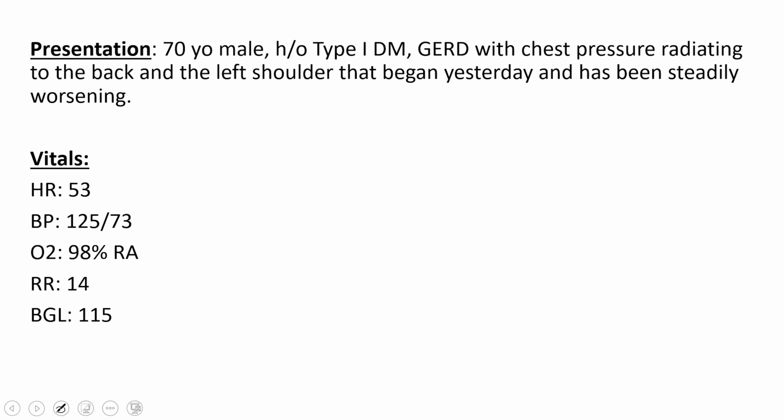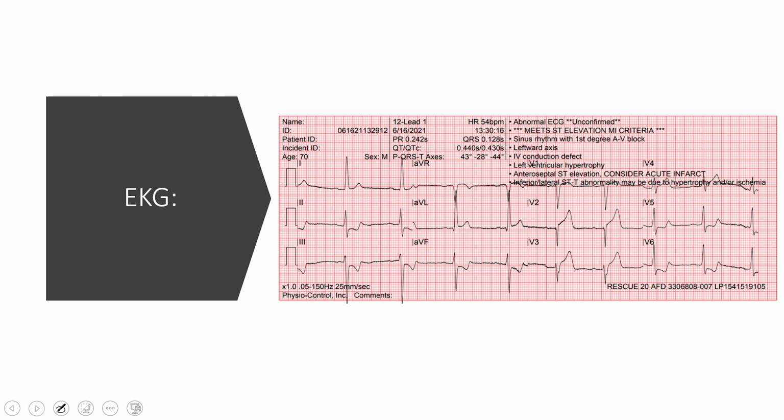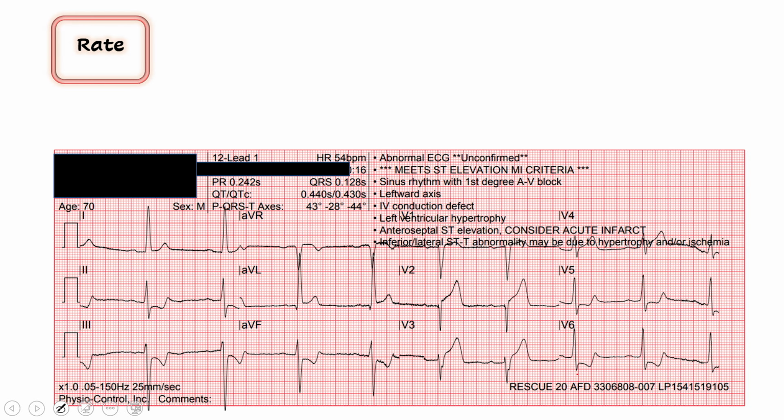This particular crew did a very good job of getting a 12 lead within 2 minutes of their arrival at the patient's bedside. And I'll give you a second to look at this, but that turns out to be a really important metric for them. So as we go through this together, we do it the same way every time.